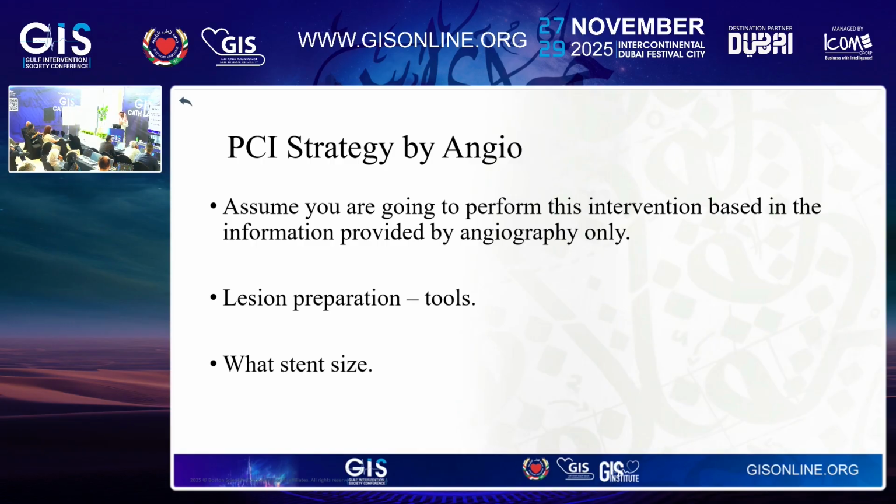And what is important for me is what is the size of my stent, and where do I start, and where do I finish. All this information is available to us, but the new thing, the workflow that we should adopt, is a clear pathway of 1 to 3 IVUS. What do I look for? What are the important pre and post?